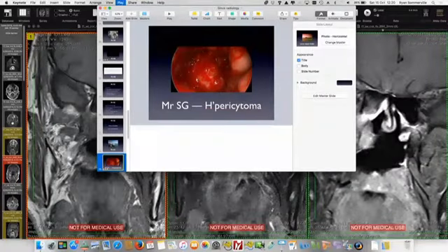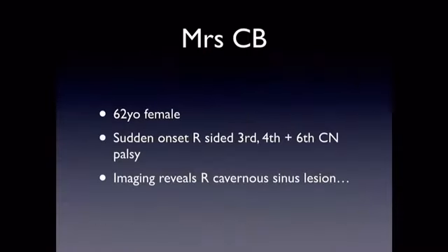So the next patient, as my last patient, is a patient that just came in recently, sudden onset 3rd, 4th and 6th cranial nerve palsies, otherwise a normal lady with no other medical problems. And the imaging reveals a cavernous sinus lesion.